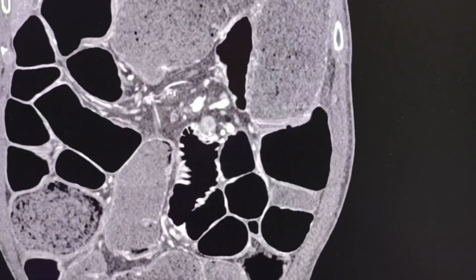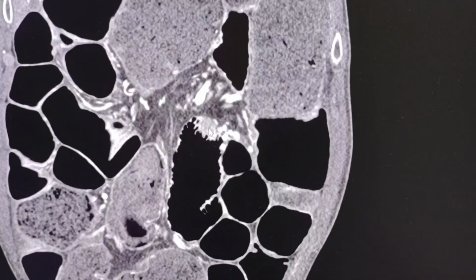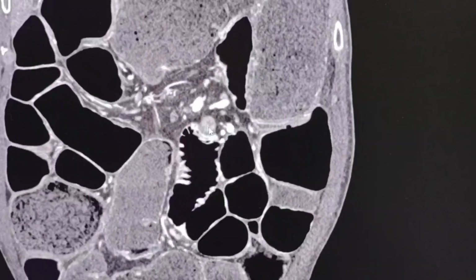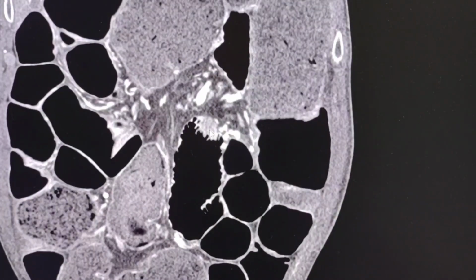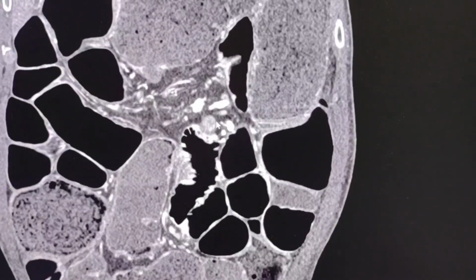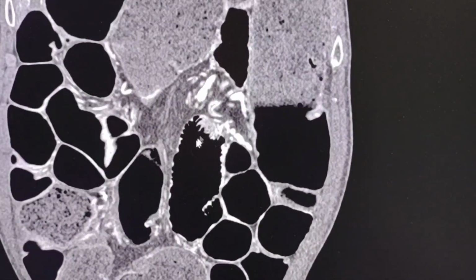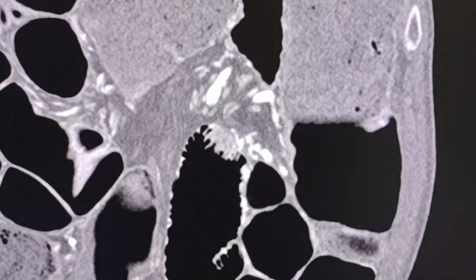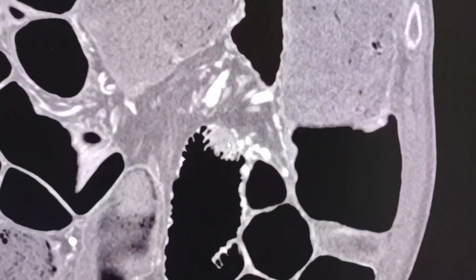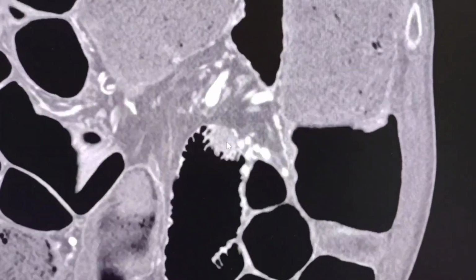Okay, and at this point there is an impression that there is a small prolapse and another transitional point, okay, from stenosis to dilatation. Probably this is a small intussusception. There is no pre-stenotic dilatation, there is post-stenotic dilatation of the small bowel here. So probably this is an incidental finding, a small intussusception. This is a possible diagnosis anyway.